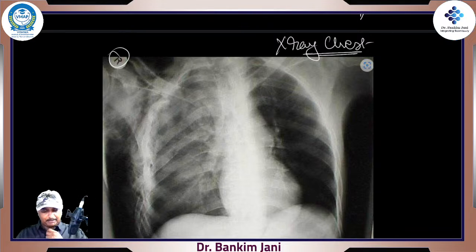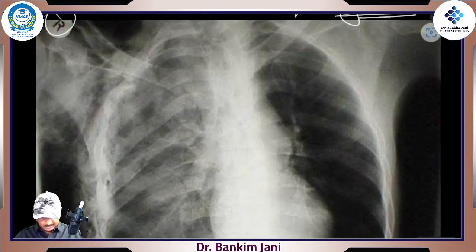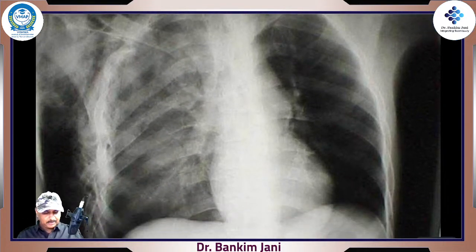But can you see the bronchovascular markings? Beautiful, right? See, so many bronchovascular markings, seen so prominently. Let me zoom in and show you. See, no doubt about it, all the way. You can see.